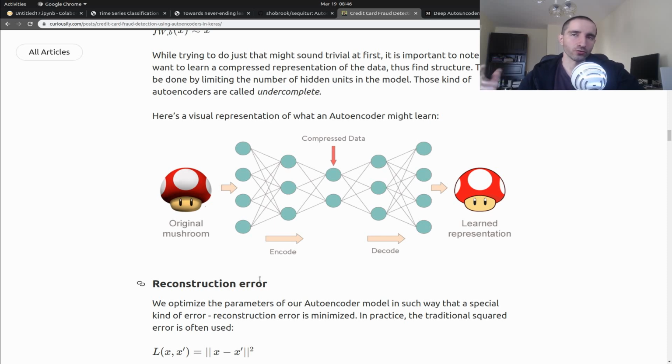So we're going to train on the normal heartbeats, and our autoencoder is going to understand what a normal heartbeat looks like. Then we're going to pass in some heartbeats that are anomalies, and our autoencoder will not be able to reconstruct those data points, and we are going to measure the reconstruction error. When that reconstruction error is high, we are going to say, well, this might be an anomaly. So let me just continue with showing you how you can do this.